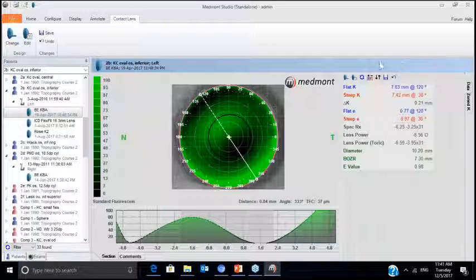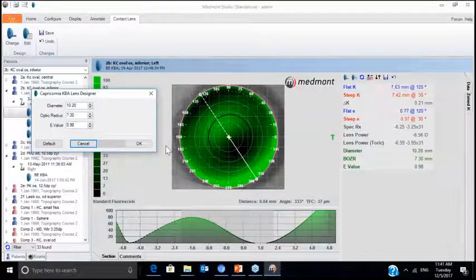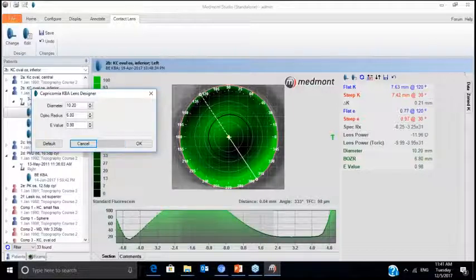And just north of center, we're at 78 microns. We might not get a bubble. But the concern is that we're going to have this heavy bearing on the cone. This lens would decenter radically. This would be unsafe for this diseased tissue. This would not be a good choice in fitting the patient.